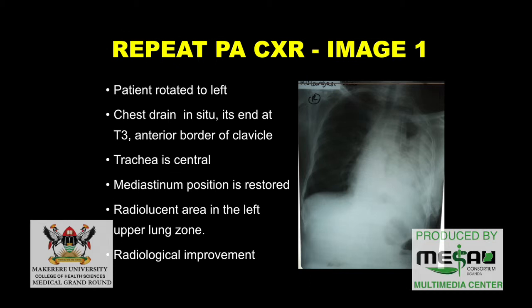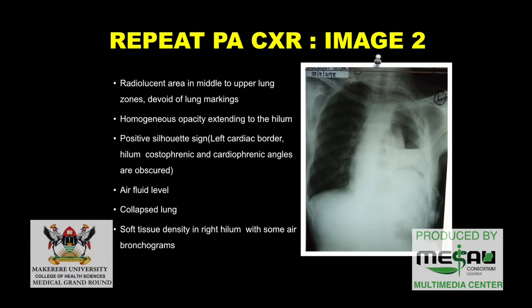And this is our tube. From that, we see that yes, the patient was getting a little bit better, because maybe the patient right now is feeling some relief. The trachea is back to normal. The breathing may be better, I don't know, that is for the managing physicians. So after some time, the patient was taken back, and we had a repeat.